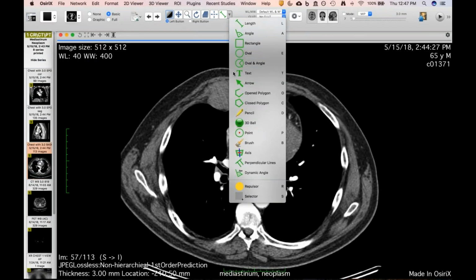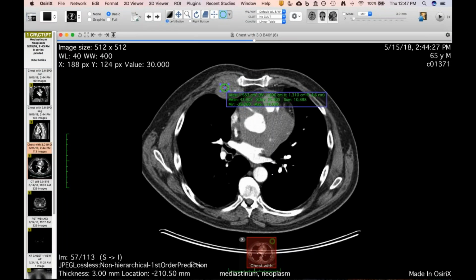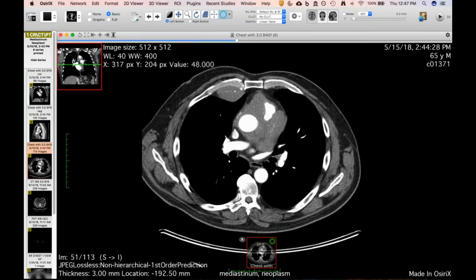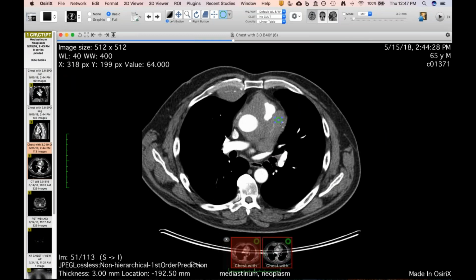Yeah, you can see it looks like it's going to be in the 40 to 60 range. 43. Yeah, and this stuff's in the 50 to 60 range, 40 to 60 range. I mean, were you thinking some sort of pseudotumor then?